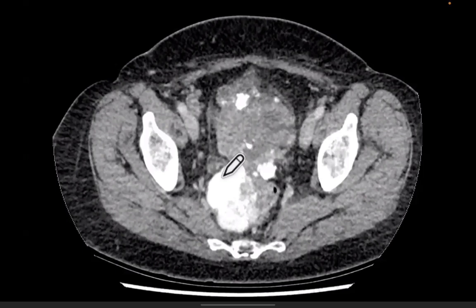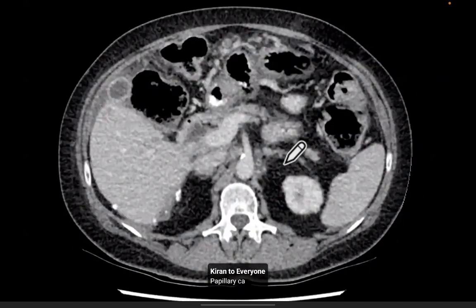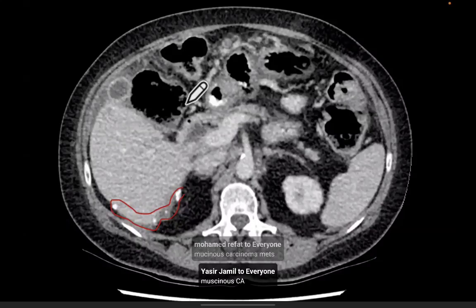You've seen it before, ovarian mass lesion with calcification, lots of deposits. So not really an omental cake, but lots of multiple cakelets. That's not the right term, by the way. That's just what I've just said. They've got areas of calcification along the peritoneum, small amount of ascites, and this is papillary carcinoma of the ovary.